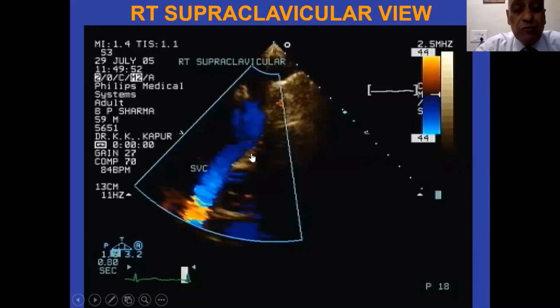You can get trabeculations. Normally, inside the left ventricle, especially at the apex, you should get 1 to 2 trabeculations. Once you start getting more than 2 trabeculations, sometimes people ask whether it is a case of non-compaction. But you should not diagnose based only on the number of trabeculations. There are other criteria to diagnose non-compaction, otherwise you make a false diagnosis. So trabeculations, false tendons, and many times artifacts at the apex.